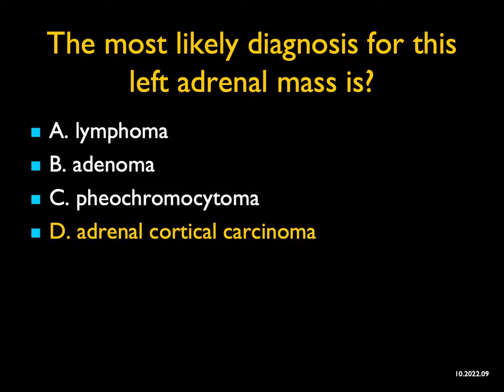Slightly atypical, but I'm showing you this case to make the point that adrenal cortical carcinomas, although they're aggressive malignancies, can have very smooth margins.